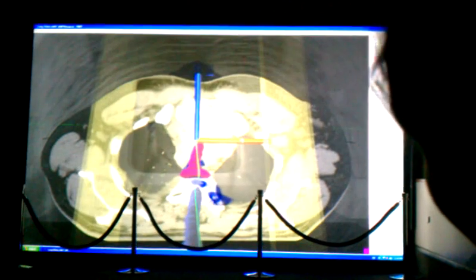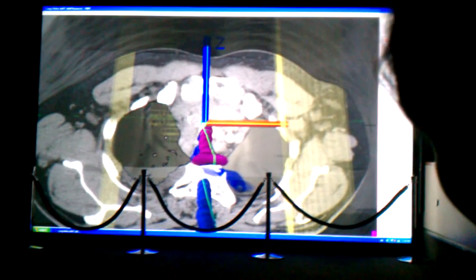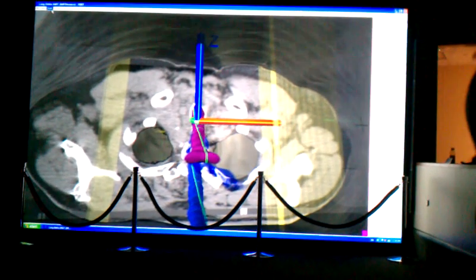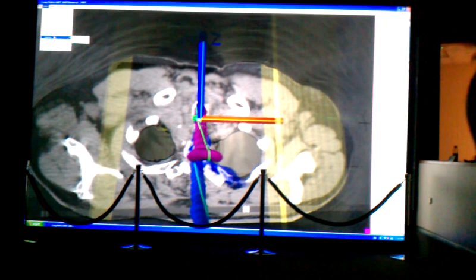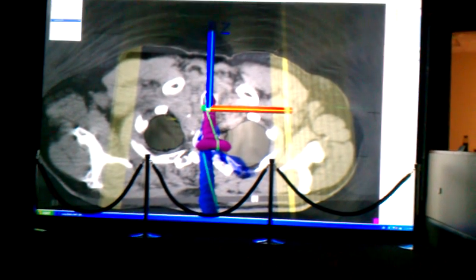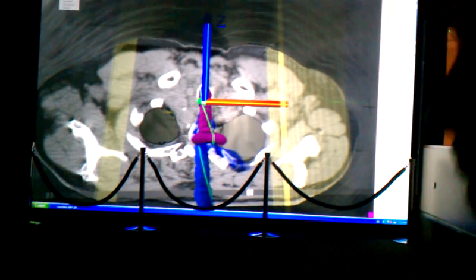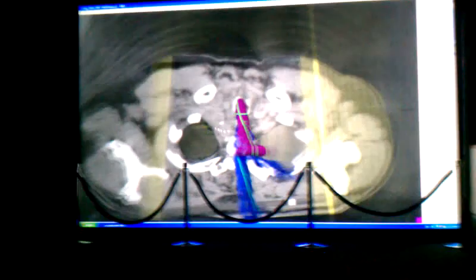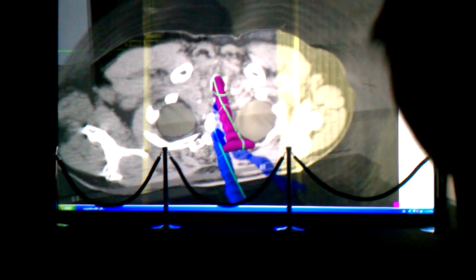And I can make my patient as transparent as I want to, or I can really get close up like I'm peering inside of the patient's body there and kind of adjust these things here. And let me take off this. Okay, take this off. We can show how the anatomy lies in the body.